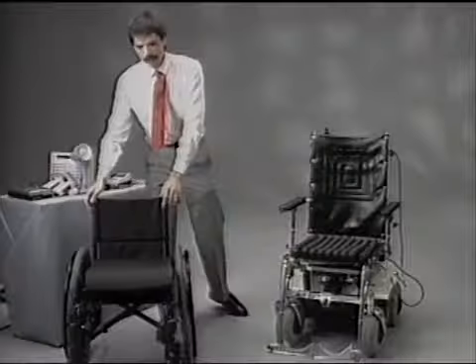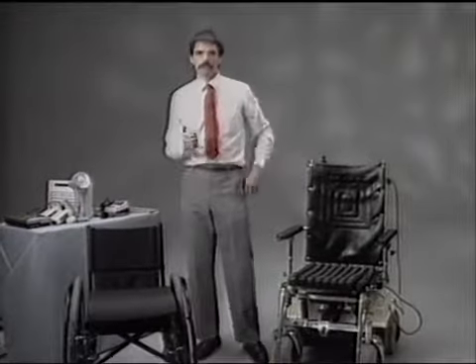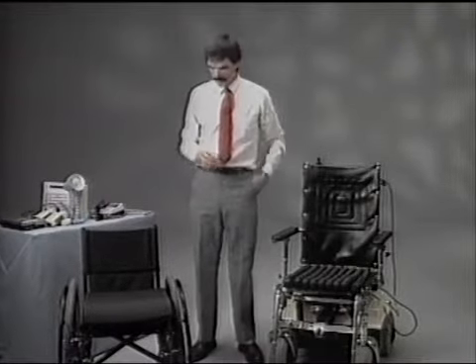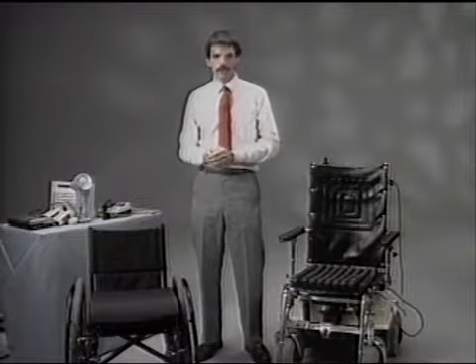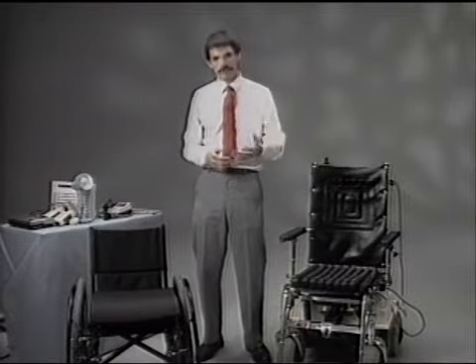It's a big change from the wheelchairs that typically weighed 60 to 70 pounds. This one weighs about 30 pounds and is easily transported into and out of a car if you're using one hand to get it in and out. And the other thing is, it's a lot easier to push a 30-pound wheelchair rather than a 60-pound wheelchair. There's 30 pounds difference in the two. Now, for individuals who use manual wheelchairs, we look at a term called functional independent mobility. That's the idea that a person in a wheelchair can move as fast as the average person walks. When we look at functional independent mobility, we look at someone who can cross a room in the same time that it takes anybody else who's walking across that room. That comes into play very clearly when you are going shopping.